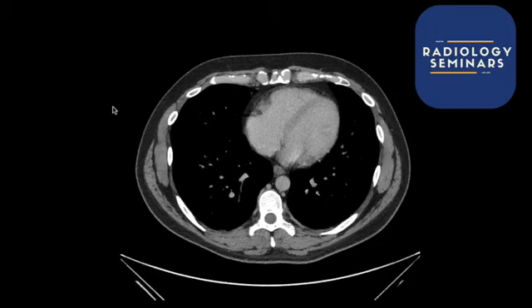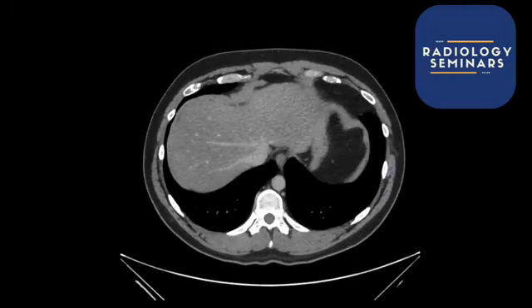It's all very exciting. Fine, so like I said, my name is Dr. Lasker. I'm a consultant radiologist, and I'm going to be going through some very basic anatomy when you're looking at a CT scan and how to approach a CT scan in your normal practice. So first of all, let's start from the beginning. This is a CT scan, okay? And do we know whether it's got contrast or not? That's going to be one of the big questions that we're going to be asking ourselves.